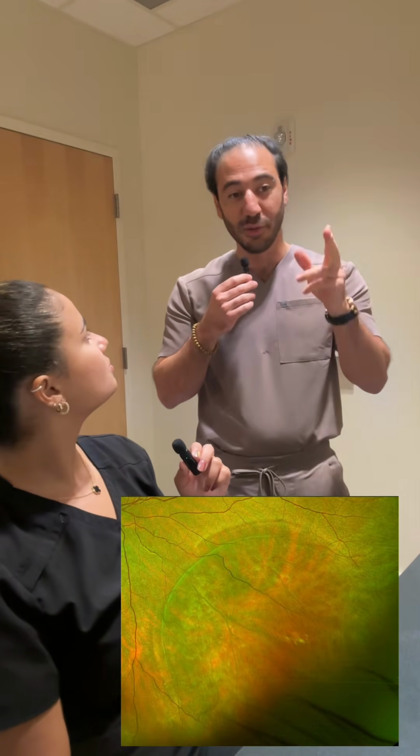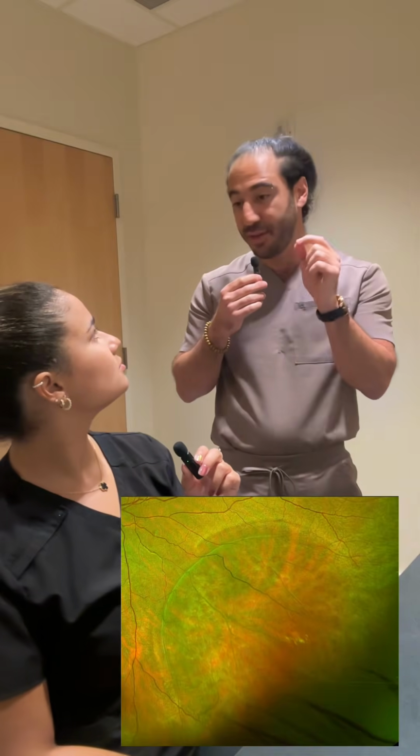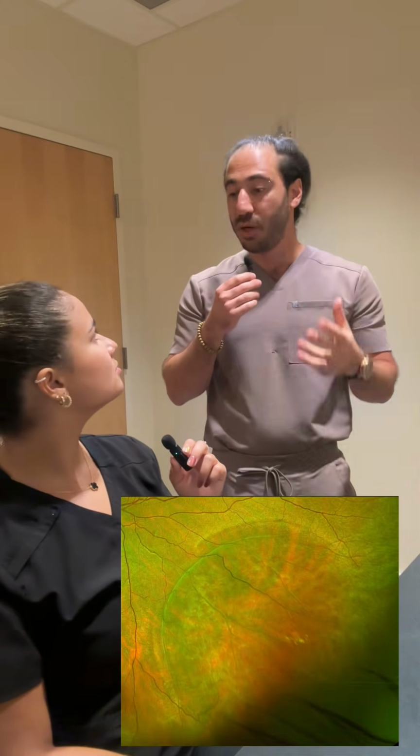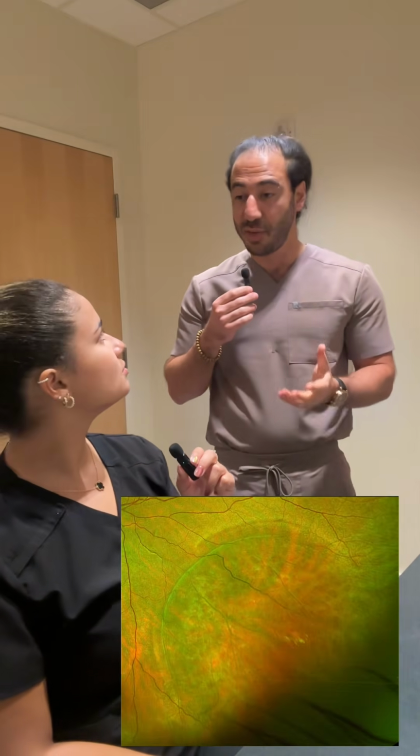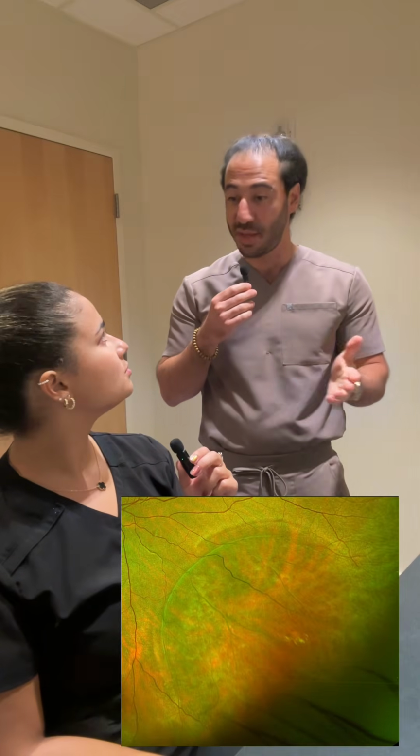Now, probably the most important is there are no breaks. I looked carefully on the exam, and you look for a little tear, a little hole, but there is nothing, right? Why? Because schisis does not have tears or breaks. And also the fact that this patient has no symptoms. Some RD patients don't have symptoms, but schisis almost never has symptoms.